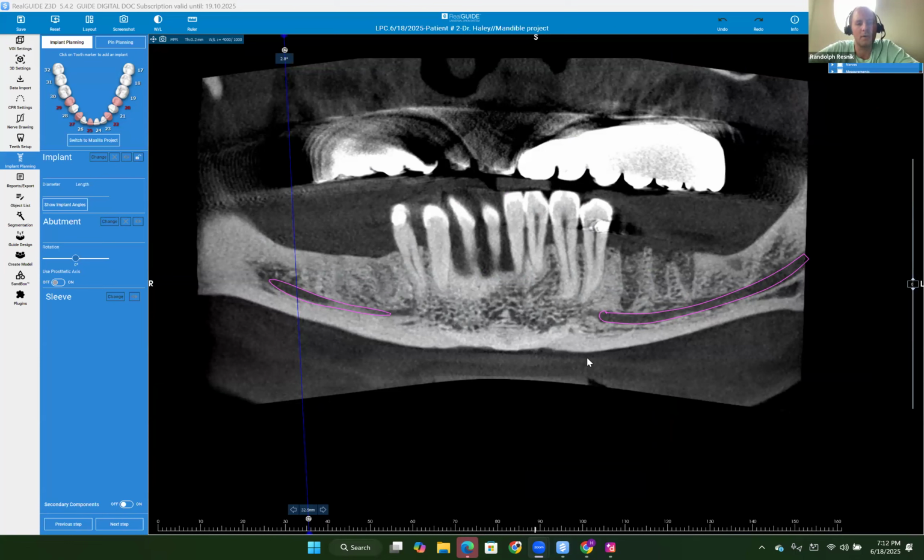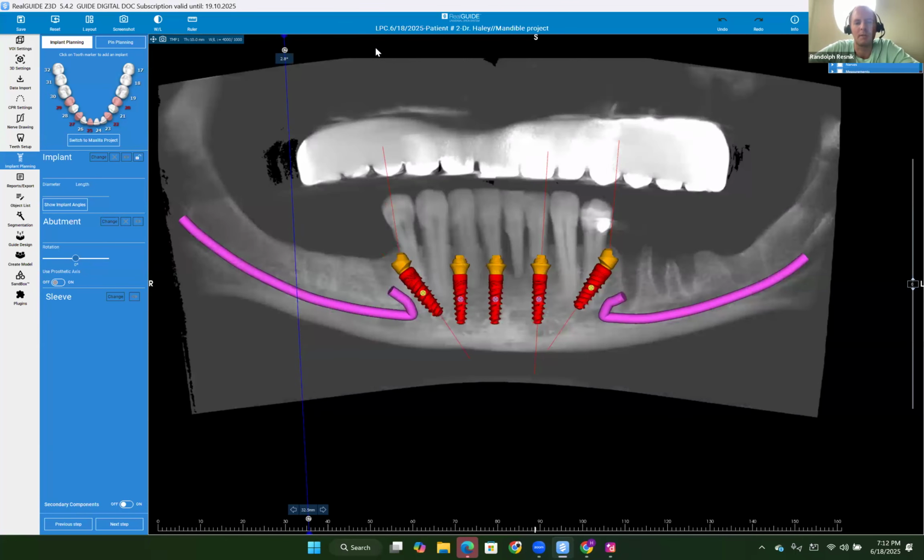Okay. So Dr. Hussein planned for 5 implants, A through E position here. We'll look at his planning and then go through some alternative treatment options. First, from just looking at the pan view, number 24 has some pathology surrounding it, so that's something we're going to try to deviate away from when placing the implant.